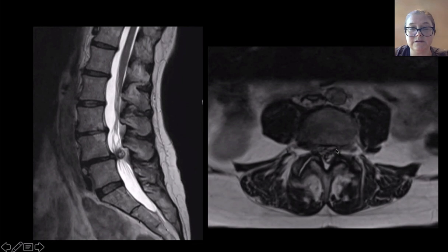They can absolutely cause problems. You can see here that the spinal canal is compressed. What do you think? Would we call that moderate? Is it severe? I still see some CSF, but the nerve roots are definitely aggregated. So more than mild, I suspect I'd call it moderate in real life.